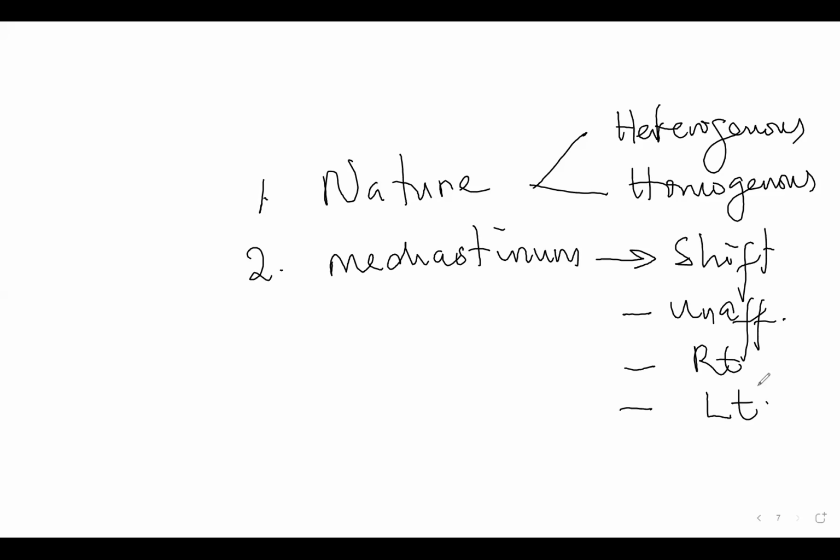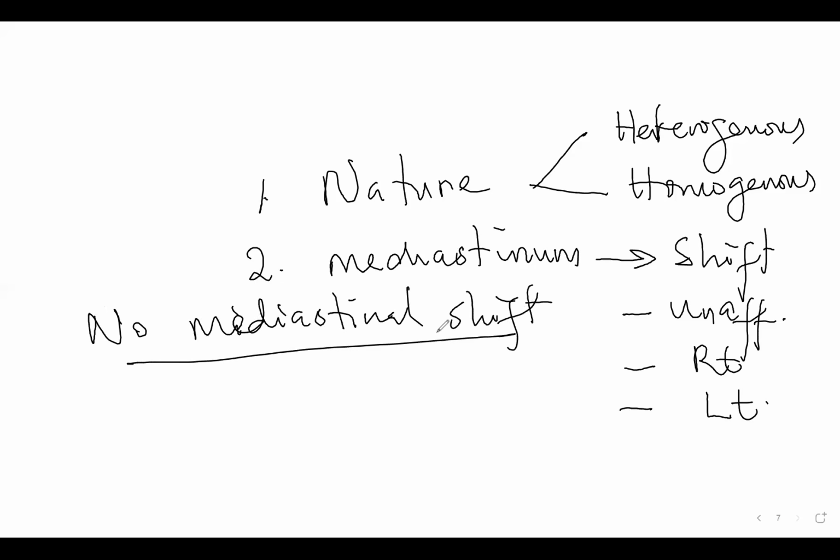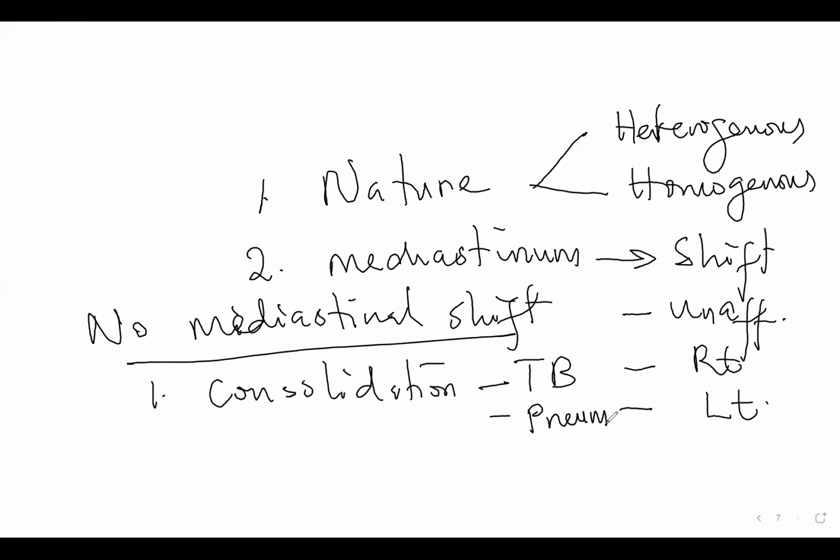Okay? Now, you should know conditions with opacities with no mediastinal shift. There's no shift of the mediastinum. One, consolidation, like TB or pneumonia, without effusion.